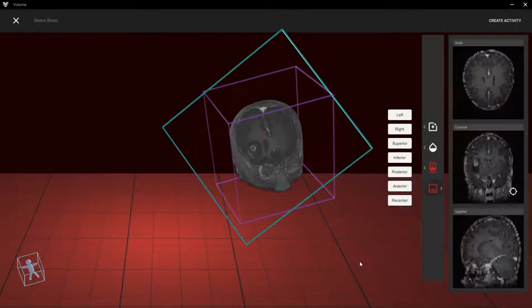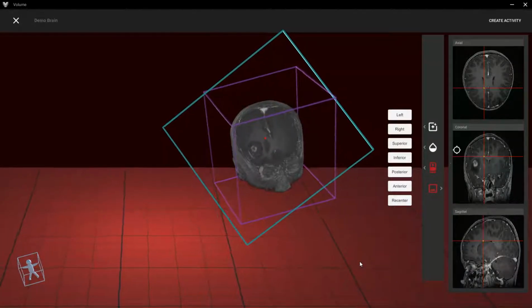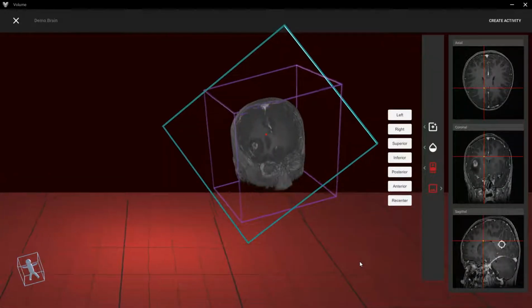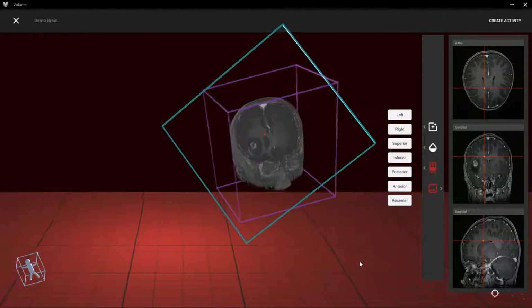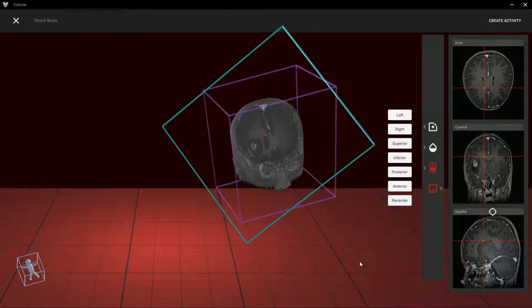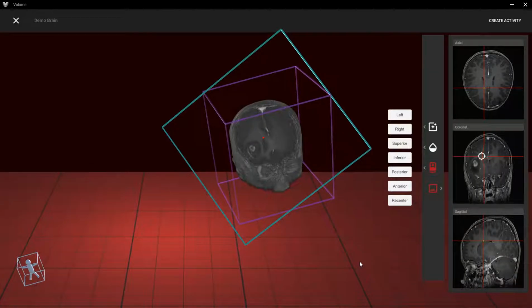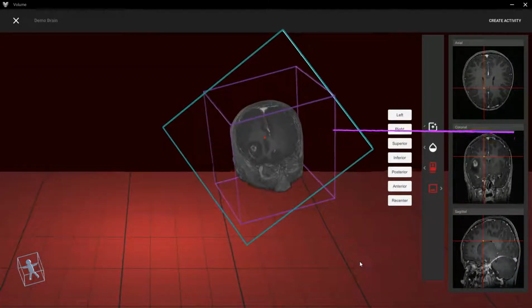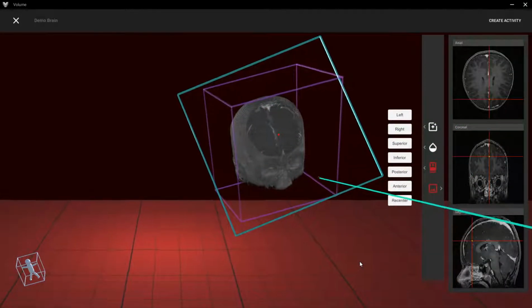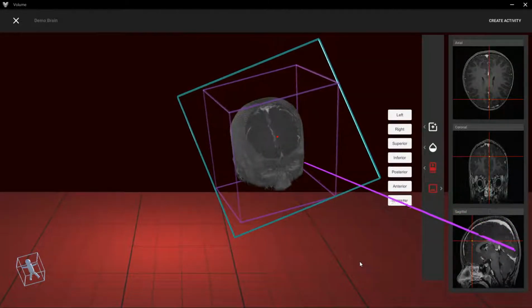Finally, let's look at Isometric Views. The Isometric Views tool gives you 3 additional views of the cutting plane: axial, coronal, and sagittal. Note how each view has crosshairs on them. The center of the crosshairs is a red dot pointer in the center of the cutting plane. These views come in very handy when pointing out important or interesting structures for educational purposes.